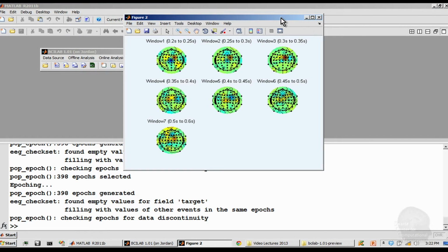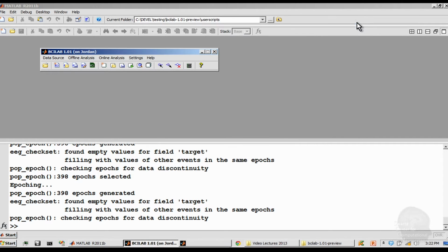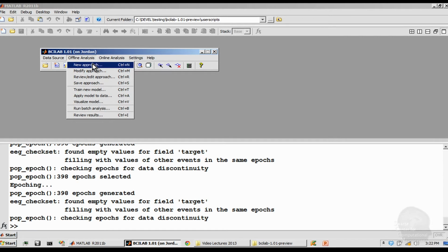And then there's a bunch of other windows where perhaps there's so much noise in the data that they are not all that important. There are, in theory, ways to localize these things better. You can work with independent components and so on. You can do a whole bunch of things. There's a couple of papers on that. I point to some of those at the end on how to properly localize that, if you want to interpret it. Of course, if you just want to run things, you don't really care about the interpretations.